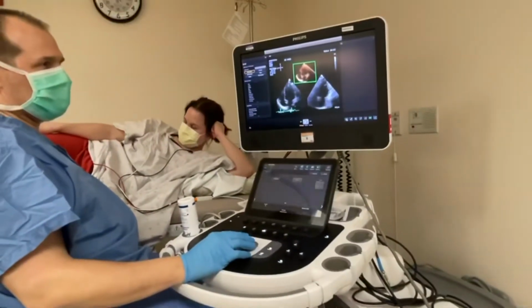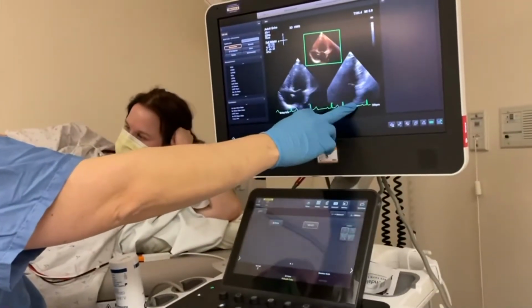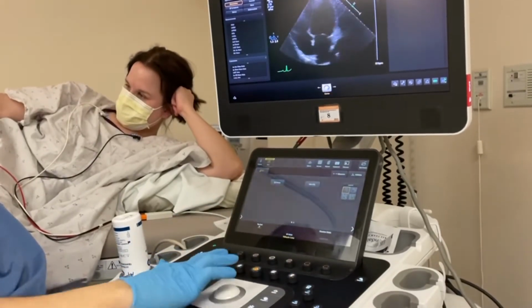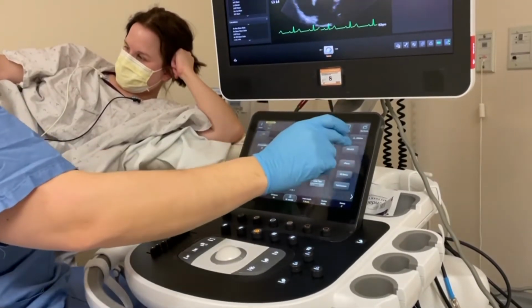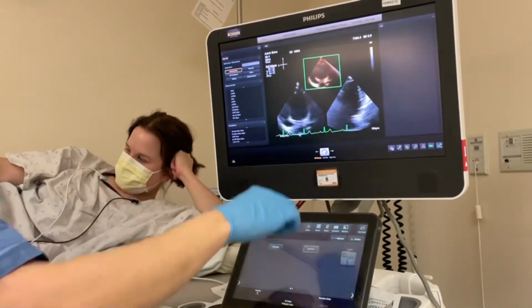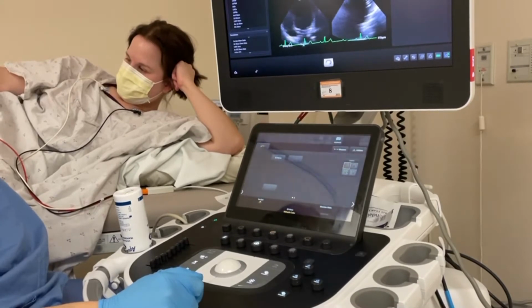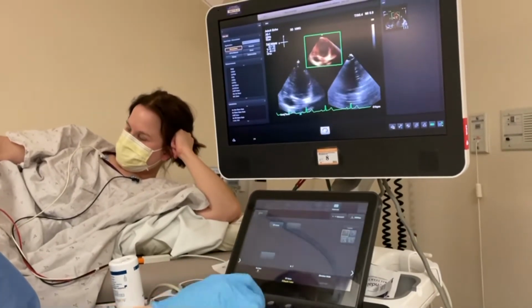And as you can see, just like X-plane, it gives us two different planes. We can see in our 3D, we're overgained here. To combat that, we can come out, drop our near field gains uncomfortably low, and hit our heart model again. And then it looks more appropriate. So we can acquire that. Here we go. When we acquire that, that's prettier there.